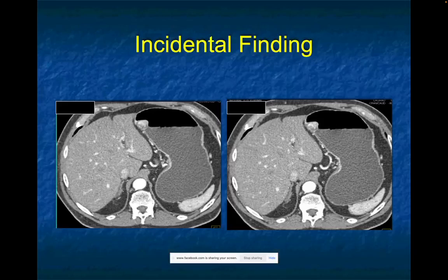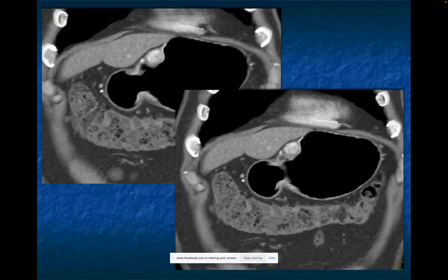Okay, another section I did with the GI tract. In this case, what do you see? You see very quickly a mass in the stomach that looks somewhat vascular, though theoretically could be calcification, but we'll say it's vascular. On the coronal, it's basically submucosal in nature. Well, what gives you vascular lesions? Neuroendocrine tumors, metastasis, those are good possibilities. Ectopic pancreas can do it. What else? Submucosal lesions, leiomyomas are a thought. But you kind of run out of things pretty quickly.